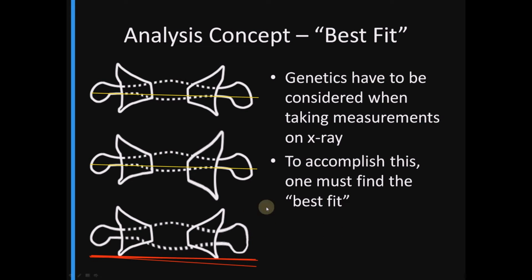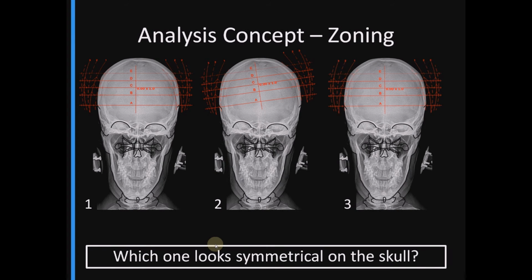The reason for that is if you look at the structure here, the height of the right arch is much wider compared to the height of the left arch, and therefore the inferior arch attachment spot is completely inconsistent with the rest of the bone and could not be used as our consistent point of reference for this atlas. In this example, we could actually use either of the other 3, but the posterior arch inferior attachment would be inconsistent. And what we would choose to use is the one point on the atlas of most clarity on the film. We could use the inferior tips or the superior aspect of the arch.